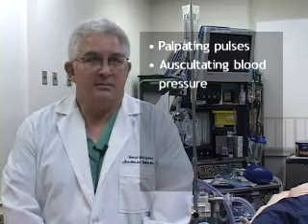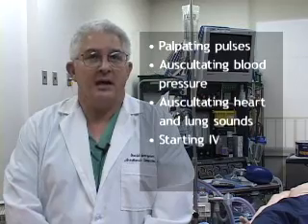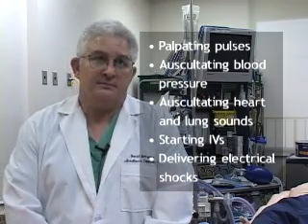There are 5 areas that require special attention: palpating pulses, auscultating blood pressure, auscultating heart sounds and lung sounds, starting IVs, and delivering electrical shocks to the mannequin.